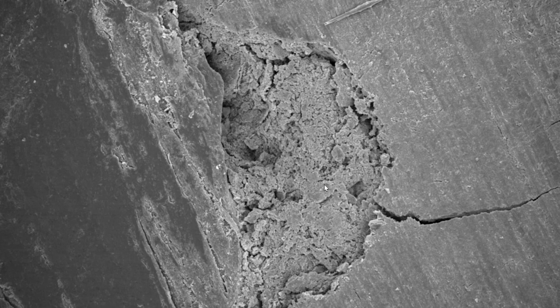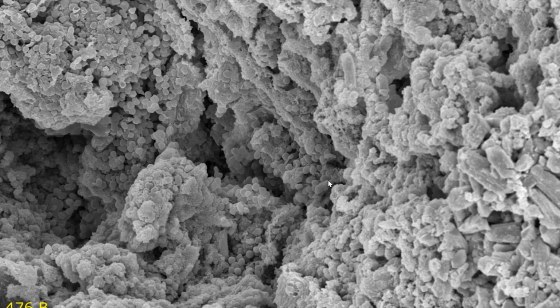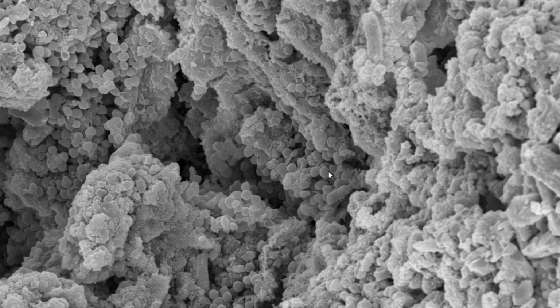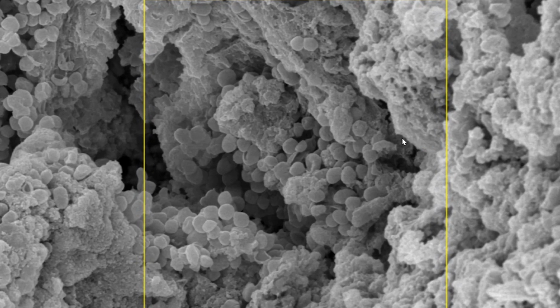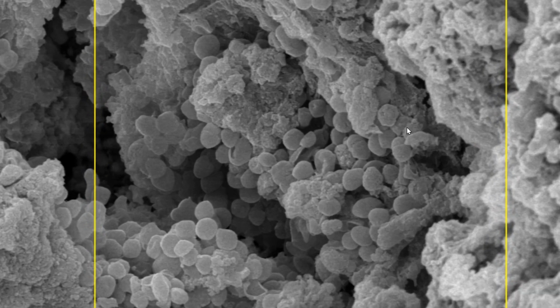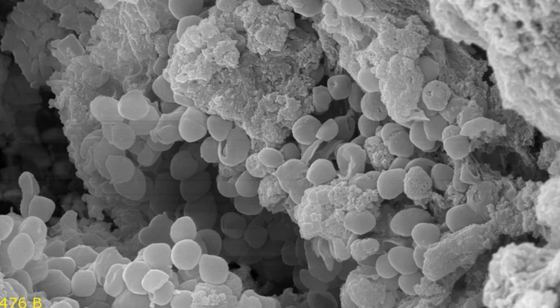But when you actually go into it and look carefully, you can see it's just impregnated with spores or yeast or fungi. And there's probably also bacteria there. The entire area is just filled with these morphotypes. You can actually see some budding going on. So we know that it is yeast, at least part of them are yeasts.